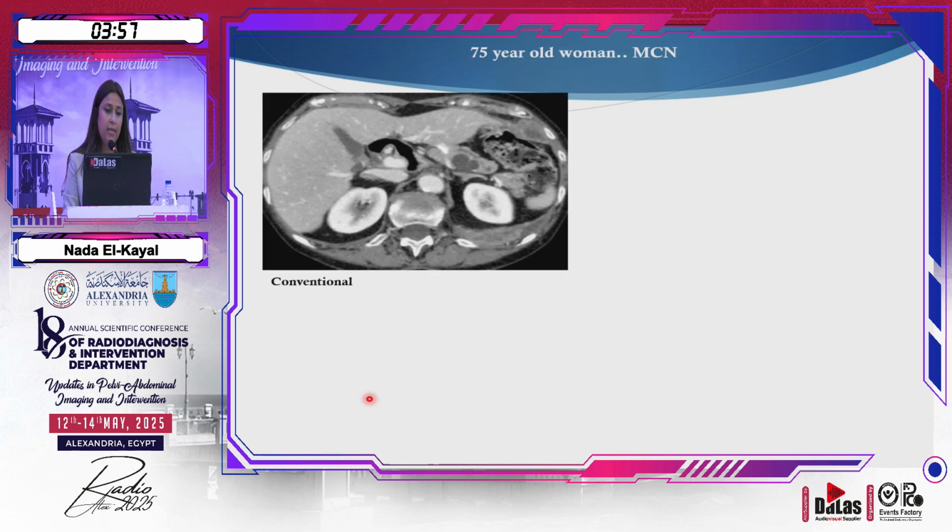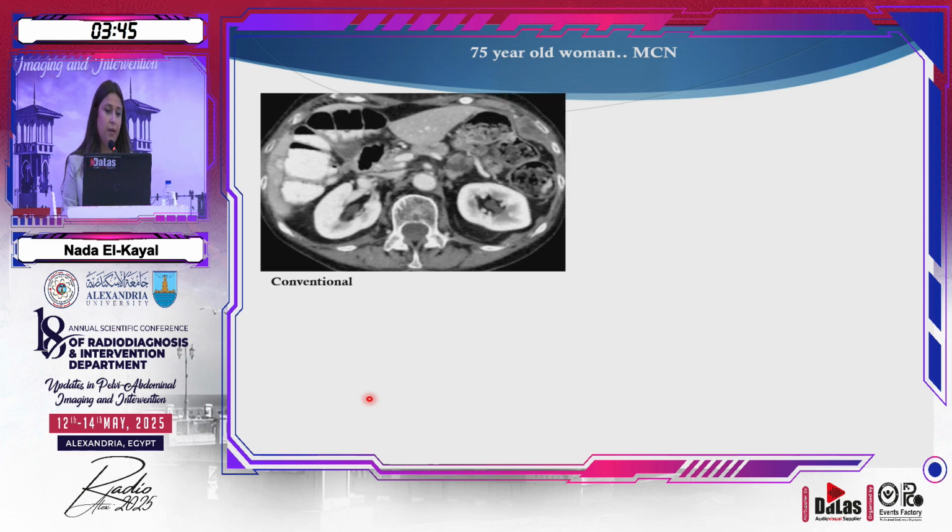Another lesion was a cystic lesion. On the conventional images, we can see that the lesion is macrolobulated with thin internal septae. There is no communication with the nearby pancreatic duct. At a lower axial cut, there are mural densities that would raise the suspicion of malignancy rather than, less likely, internal cyst debris or content.